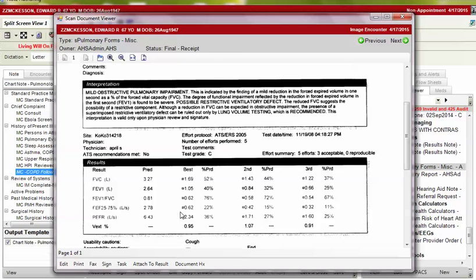The very first value I look at in interpreting the results is the FEV1/FVC ratio. This value is based on the lower limits of normal, and it determines whether or not the patient is having airflow obstruction. A normal value would be 0.70 or better. In this case, you're going to want to look at the actual value, which is 0.62, which indicates this patient has airflow obstruction.